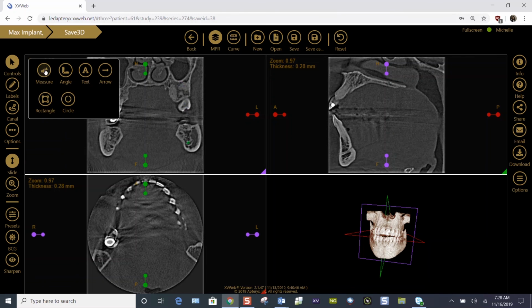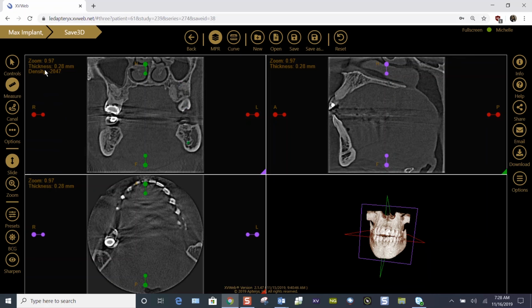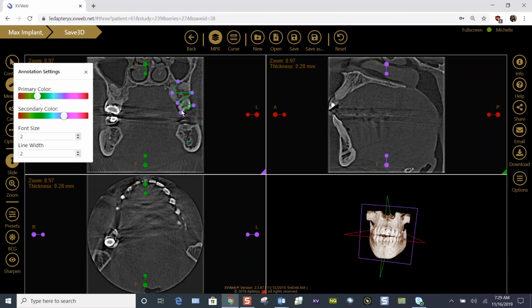I'm going to left click and show you that if you did need to make any directional changes in your measurement, you simply do that by left clicking. So you can left click and change directions, and then double left click when you're done with your measurement. So left click, left click, left click, and double left click. An exaggerated demonstration, but if you do need to change directions on a very curved route, you can do that. And then you can delete that.